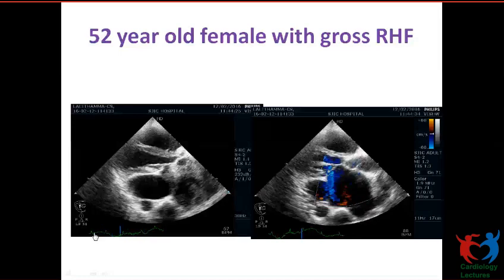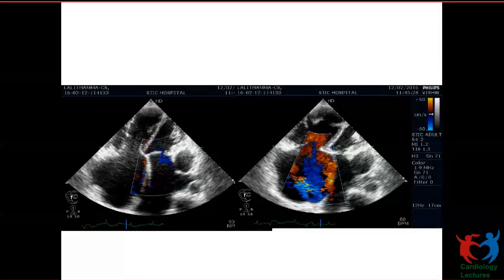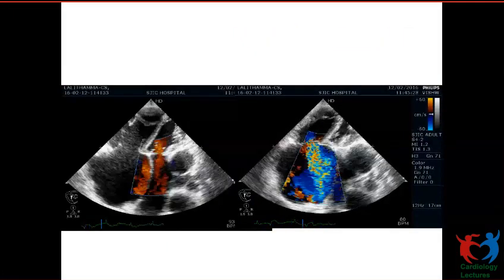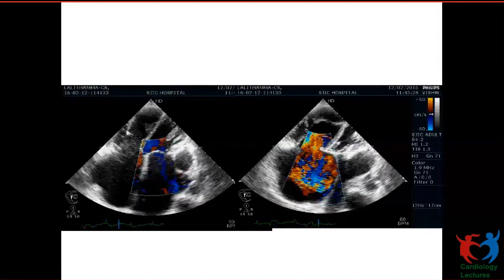Okay, so you should know the differential diagnosis at this stage. Now you see. Madam, is this right aortic arch in this case? No, this is not right aortic arch. You are seeing the arch and the descending thoracic aorta. It's normal, so it tells you that it's a normal left aortic arch. If it is not there, we have to suspect right side. It is our favorite question of our director. That is not coronary sinus, madam.